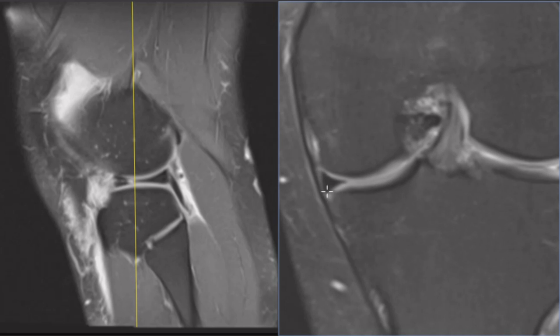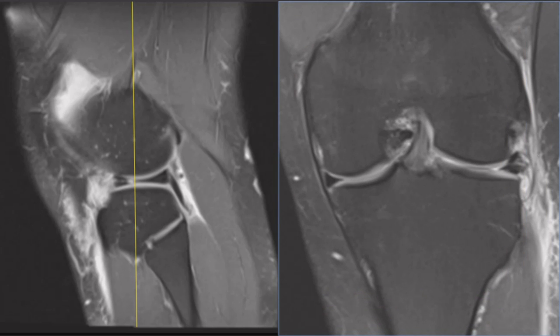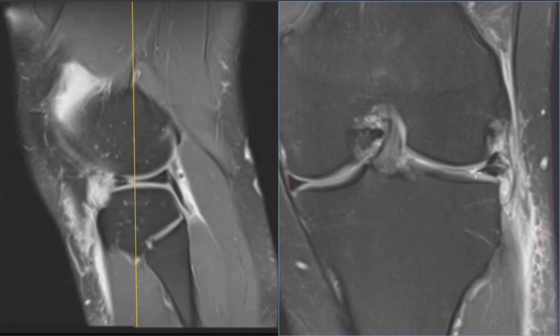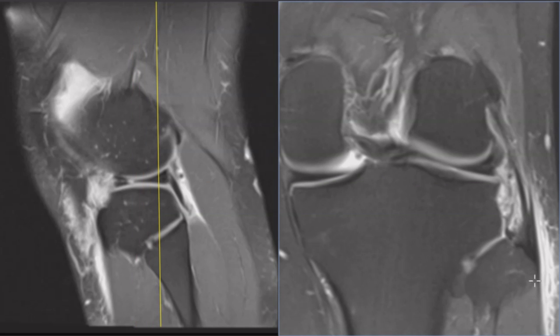This is the meniscocapsular junction of the medial meniscus, looking nice and normal, smooth, and the outer side of the lateral meniscus is irregular, it's kind of globular, so they have a tear of the lateral joint capsule out here, allowing for fluid to extravasate and go down the lateral knee.